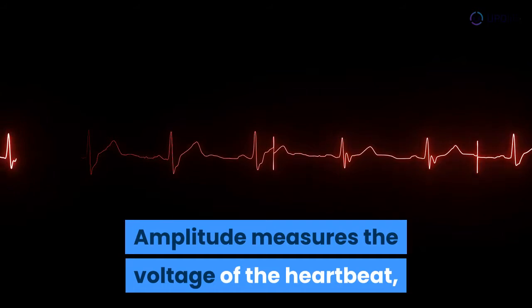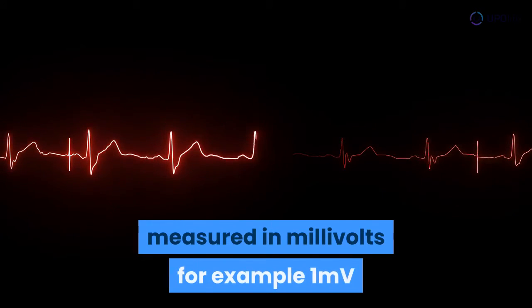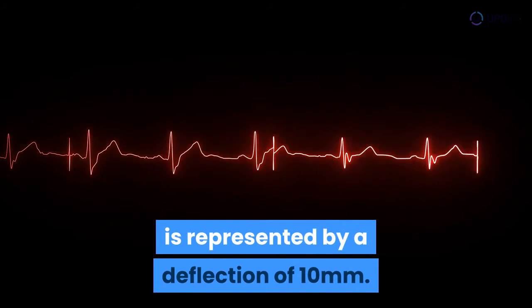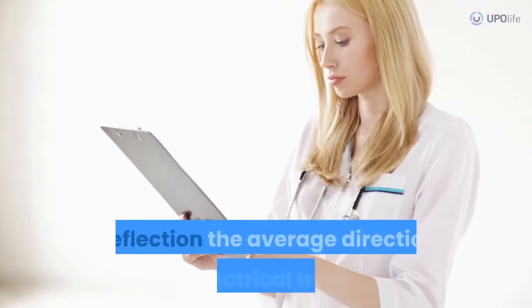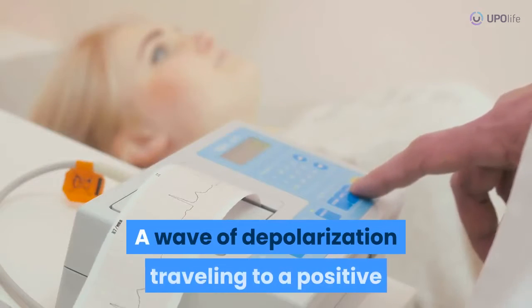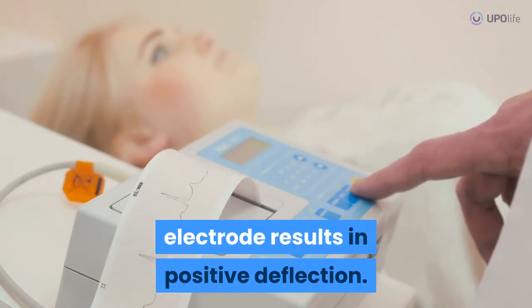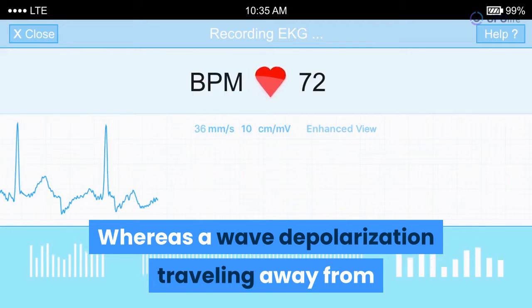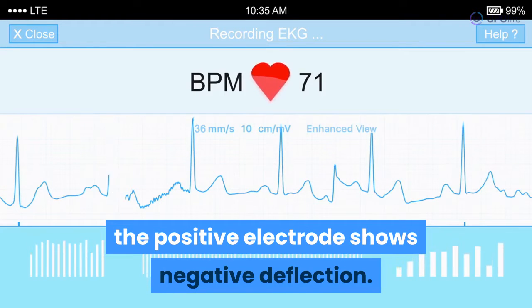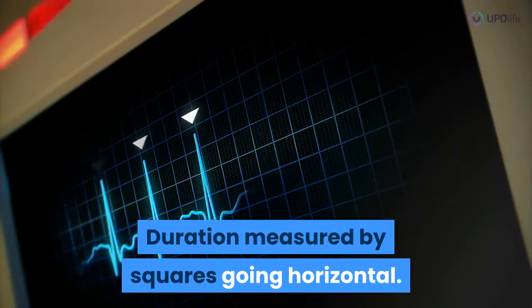Amplitude measures the voltage of the heartbeat, expressed in the vertical dimension, measured in millivolts. For example, 1 millivolt is represented by a deflection of 10 mm. Deflection is the average direction of electrical travel. A wave of depolarization traveling to a positive electrode results in positive deflection, whereas a wave of depolarization traveling away from the positive electrode shows negative deflection. Duration is measured by squares going horizontally.